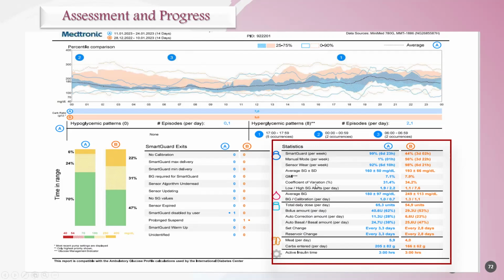In other words, that will mean we have good behavior time. So if you have fluctuations, that means sometimes he injects, sometimes he announces a carb, sometimes no. So it will give you great variation. So it will reflect the behaviors mainly. Low glucose, it will tell how many per day. And sometimes the low glucose, to be detected, needs to be more than 30 minutes in duration.